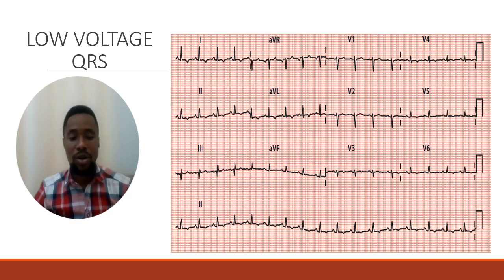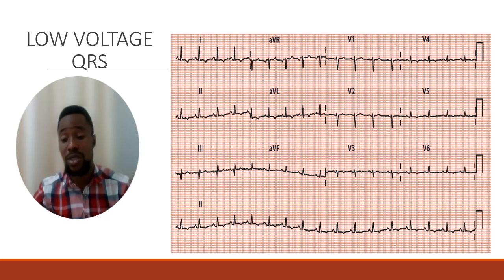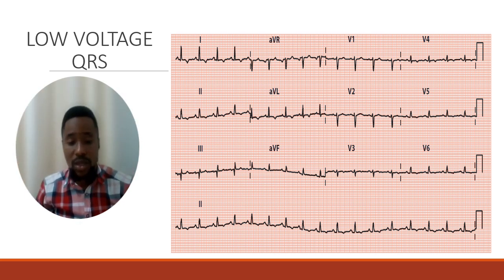One amazing thing of the QRS complex is when we talk about the voltage of the QRS complex. The voltage of the QRS complex could be higher than normal and also can be lesser than normal. Voltage is the same thing as amplitude, millivolts. So voltage means vertical, how tall it is. Now, when do you say you're having a low voltage QRS complex? You say you have a low voltage QRS complex when the QRS complex is actually lesser than 5 millimeters, that's a big box, on the limb leads. Limb leads are lead 1, lead 2, lead 3.